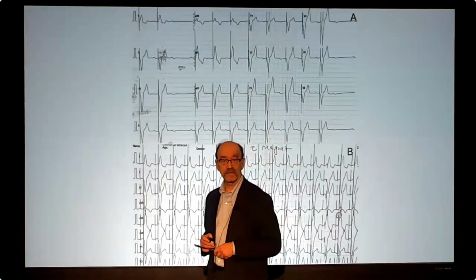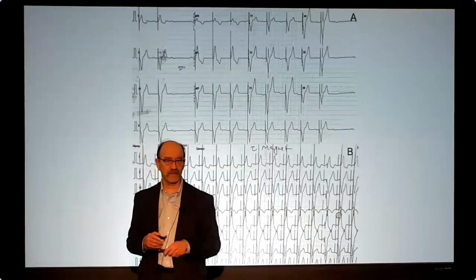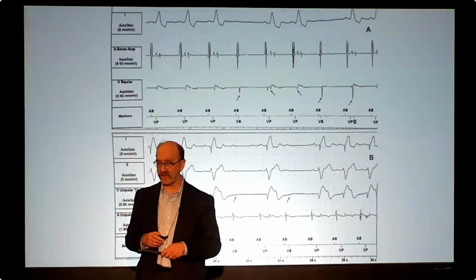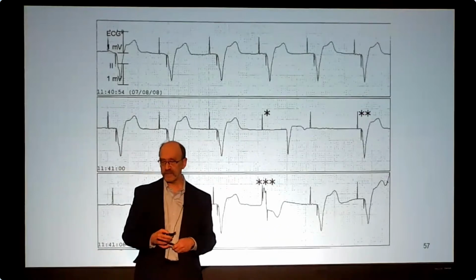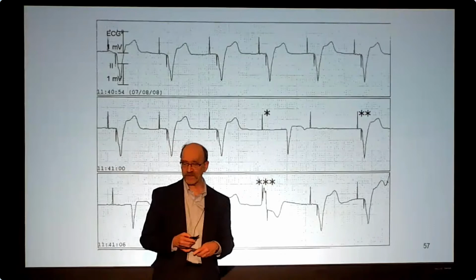Correct. From where? Excellent. Perfect. This was another ventricular lead failure in insulation, and this is just the tracing showing some oversensing on the intracardiacs. Okay. So what's going on here? There are asterisks and triple asterisks.